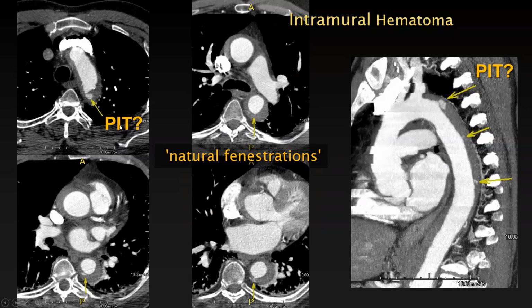And I would think that the most proximal lesion here is just the equivalent of a primary intima tear, as you can see in aortic dissection. For some reason, it's smaller. And once the blood got into that false lumen, it probably rushed down here, the descending thoracic aorta. Maybe it didn't find an outflow where the blood could rush out again, and so it just coagulated.